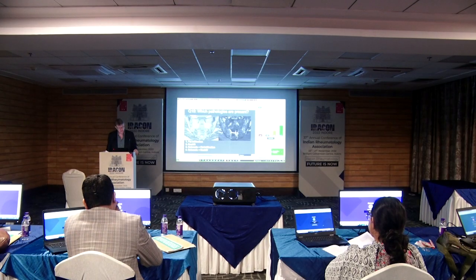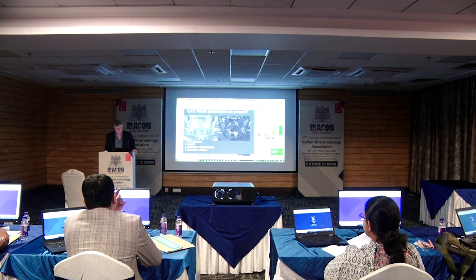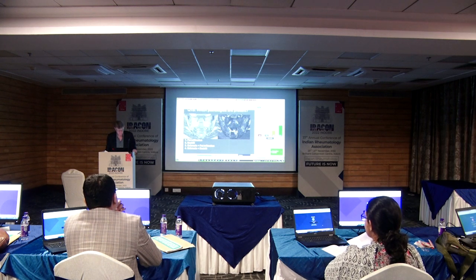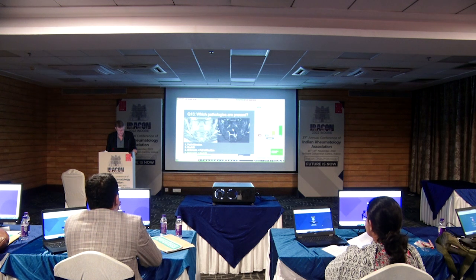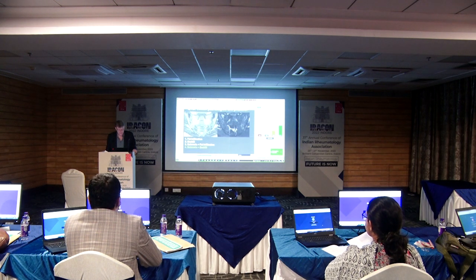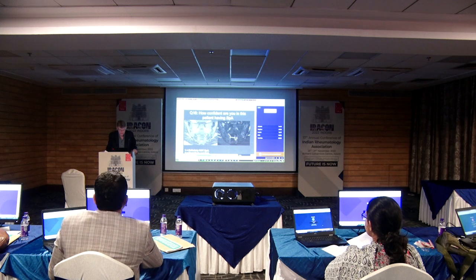I don't think that it's homogeneous, and I think that it fades out more than it's sharply marked. But that could be discussed. So therefore, I think this is the correct answer. And then we have the last question, which is the usual one with how confident you are.